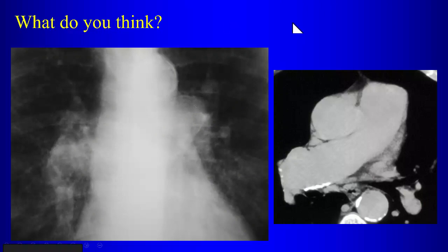What do we think of this? Pulmonary artery calcification. Yeah, so there's pulmonary artery calcification. The significance of pulmonary artery calcification is what? Pulmonary hypertension, right? Clots can calcify. So chronic pulmonary embolism can calcify. If you see peripheral filling defects that are calcified, then you're dealing with chronic PE, right? But calcification along the wall of the pulmonary artery itself pretty much always means pulmonary hypertension, okay?